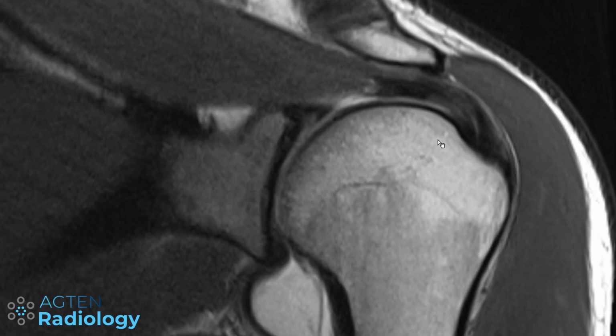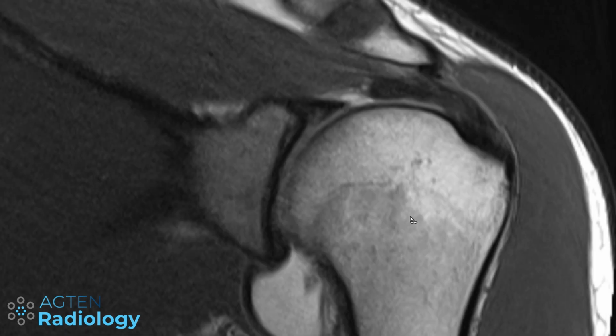So this is the first case, and if you don't agree with my judgment, basically you just have a different calibration, which is completely fine and understandable. So I just give you my approach here, with the risk of maybe having a different opinion than some of you guys, but that's not the problem.